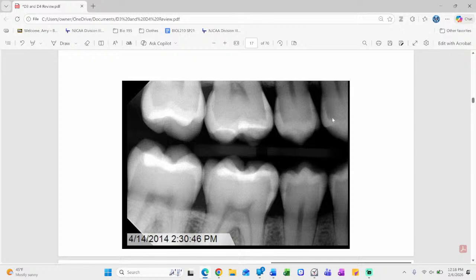Maybe this is incipient. Here we're into dentin. Also dentin. Even here, distal of 30, you can see that. So we get that little bit of overlap, but I can still see where the caries are. Bone levels within normal.